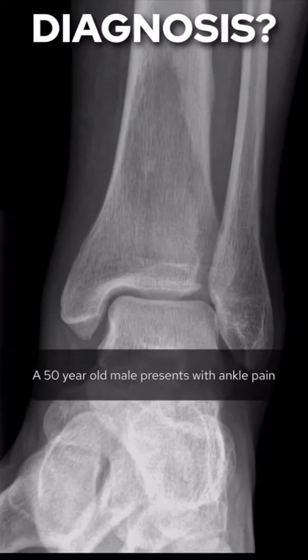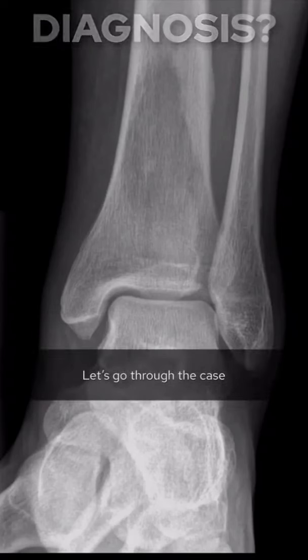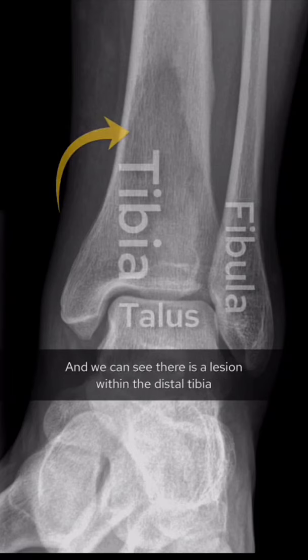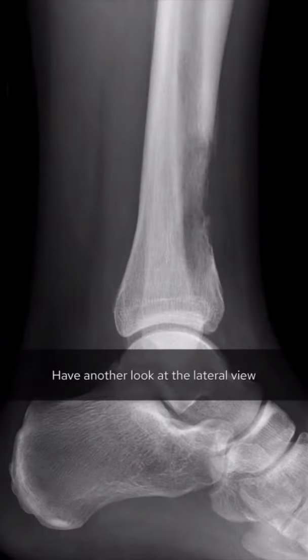A 50-year-old male presents with ankle pain. Is the x-ray worrying? Let's go through the case. Here we have an x-ray of the ankle, and we can see there is a lesion within the distal tibia. Have another look at the lateral view.